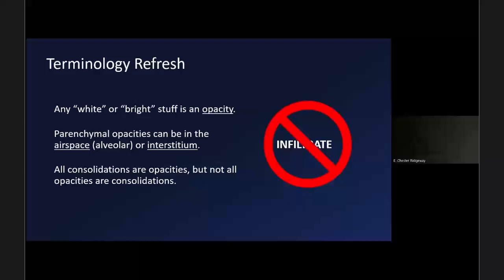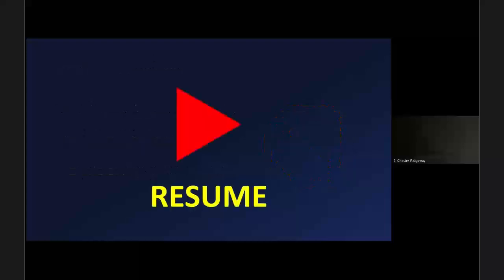Now here's the fun part. All consolidations are opacities, but not all opacities are consolidations. I will explain a little bit, but I just want to kind of sow the seeds right now. And again, we do not use the word infiltrate anymore, okay? If it slips in, that's okay, but just be aware that that's just not the terminology that we use anymore. All right, so now we can resume back where we were at.